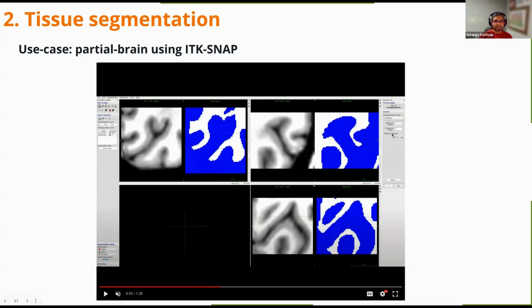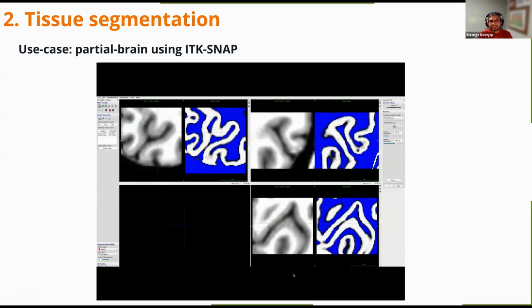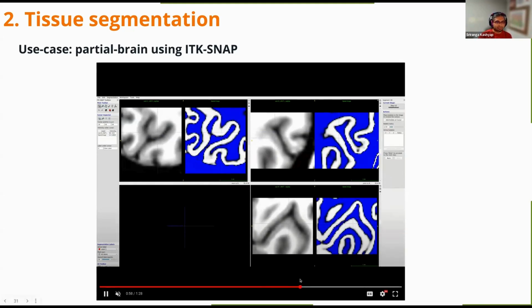And you can already see with the clustering approach, there are like segmentations there. But even if you do thresholding, because it's a T1, you can get a very good gray matter mask already. And you can play with this threshold. And again, the same as before, you drop a couple of bubbles in red.